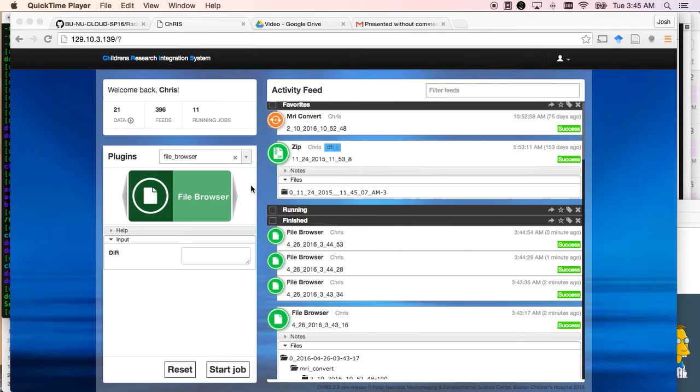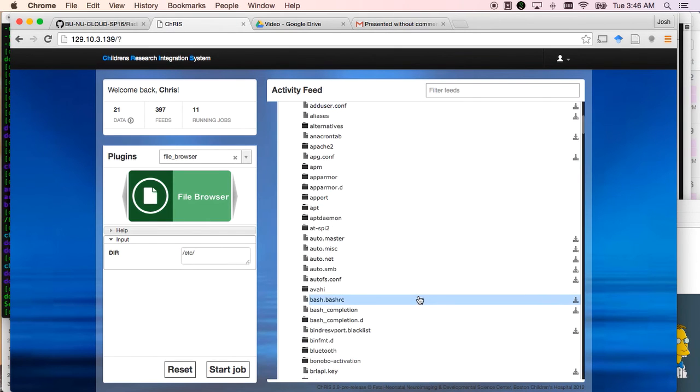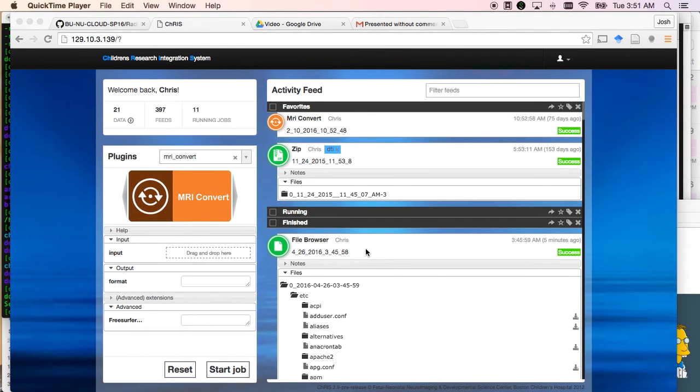One of the interesting things about working with CRIS is that it blends both the Python front end with the command line back end. If you're not careful, or if you have a user who's a little curious, there is quite a lot that you can find. I may not be a major hacker, but there might be some evil that somebody could do with this. With the file browser, allowing us some relatively inside information about the workings of the system, having potentially unsanitized shell input creates a whole lot of problems.